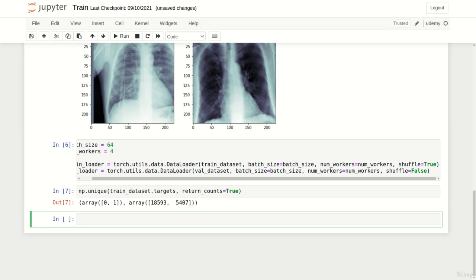When using oversampling, the overall goal is to show the network as many samples from class 1 as from class 0. In this example, we will test to use a weighted loss of 3, as there are roughly 3 times as much images without pneumonia as there are with. Alright, now the data loading routine is complete and we are ready to implement the model.